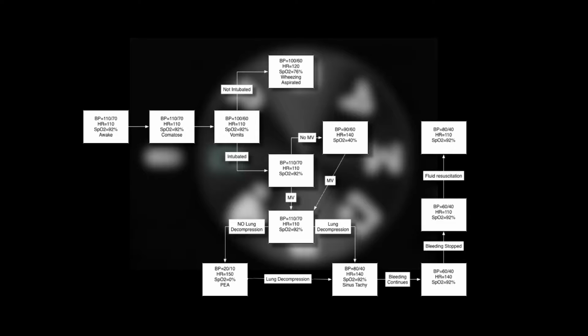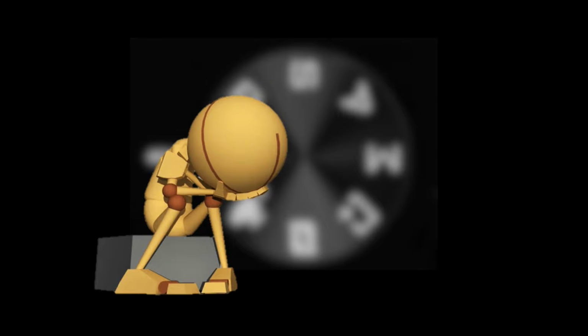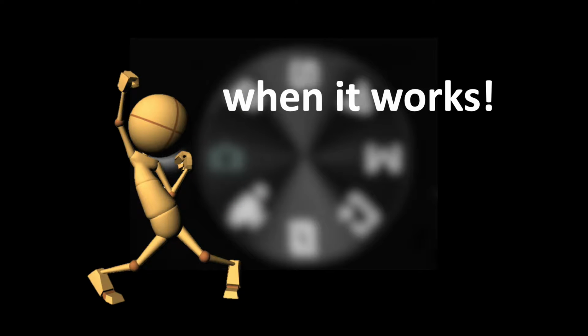Or when a timeout is called, faculty would like the learners to back up a few steps in the scenario and start up again. Oftentimes, using even our own traditionally programmed software, we would have to restart the program and fast forward to where we needed to be and then continue on. Using the scenario programming method that I'm going to show you today will save you time, money, energy, and a lot of headaches, not only for you, but for faculty and students.